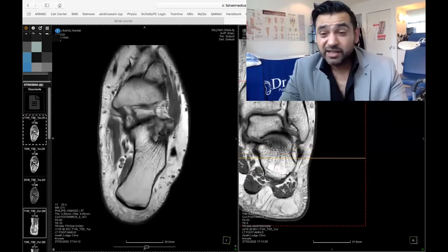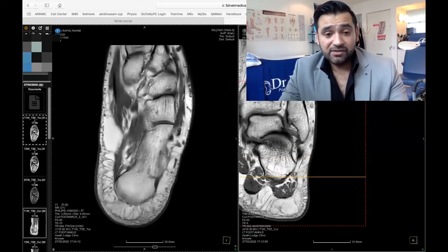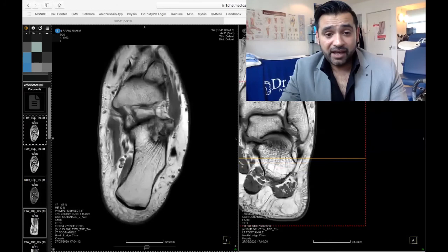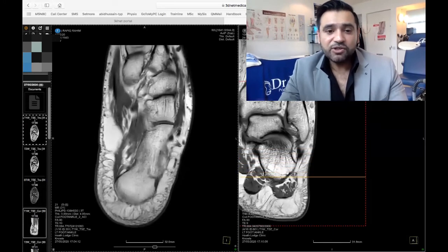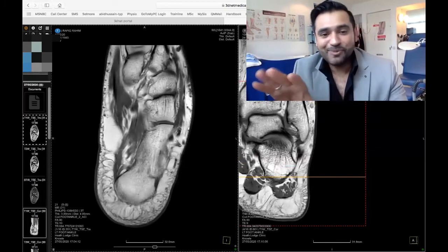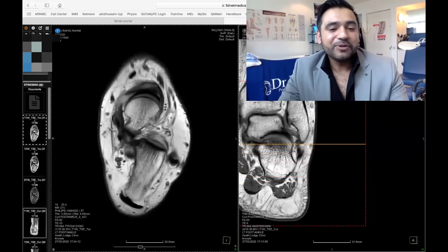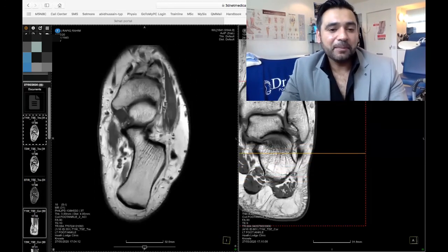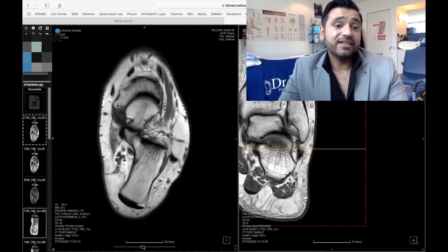It could be the calcaneocuboid ligament that has got an issue with it. So it might be that, rather than the cuboid itself moving out of place, which we know physically is just not happening, it's not possible, it ain't going to sublux. But there could be scar tissue around that area, actually, for various different reasons.